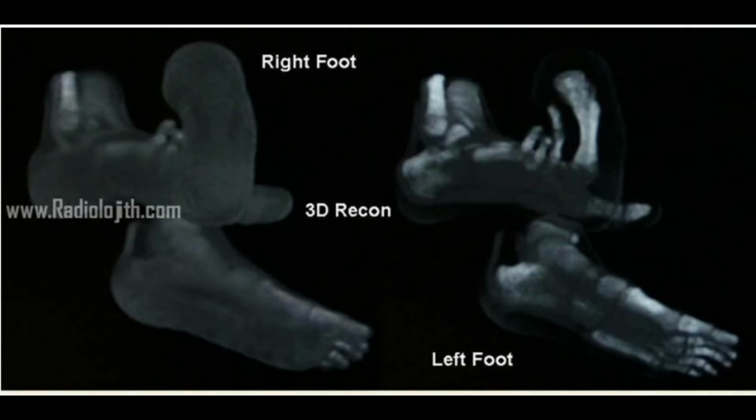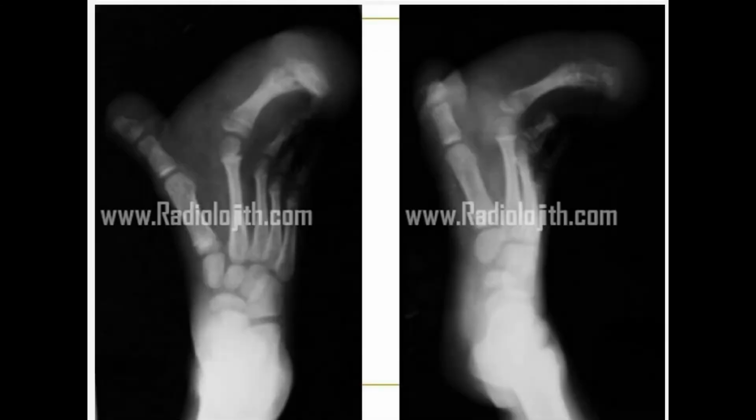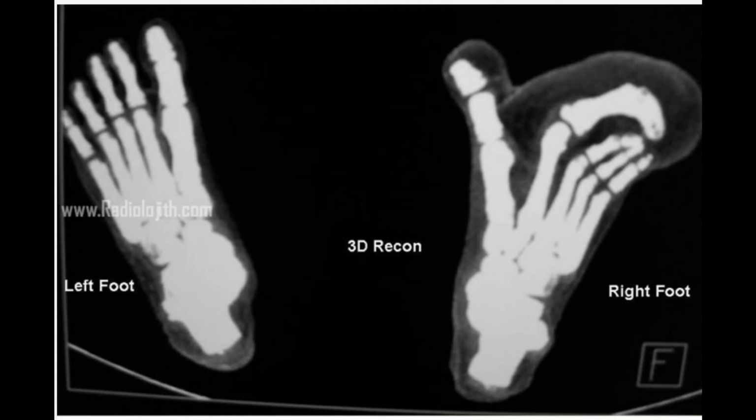Remember that it is painless and that it is progressive from infancy. Now think, what's the diagnosis? If you want more time, please pause the images and see again. Now we can go for the diagnosis and discussion within a few seconds.